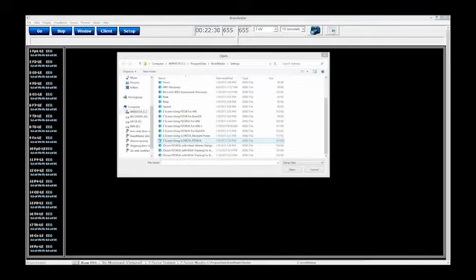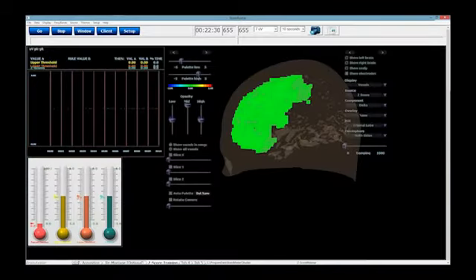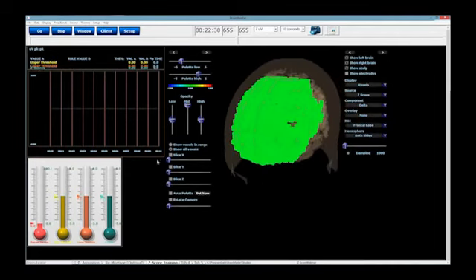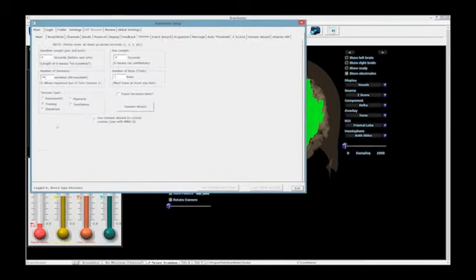So the first one I'm going to go through, and I'm going to show you a couple neat tricks that we have with this one, is Z-scores using sLORETA Absolute Power. So I'm going to double click this one. Now you're going to notice right off the bat that there is not that much change in the first 2 pages. Acquisition is the same, remontage is the same. Z-score Training, on the other hand, is where we're different. Now all of a sudden I have all these different thermometers, this one little graph, and my head map right here. So let's actually see this in action so we can get a little more information and understanding of what is going on.